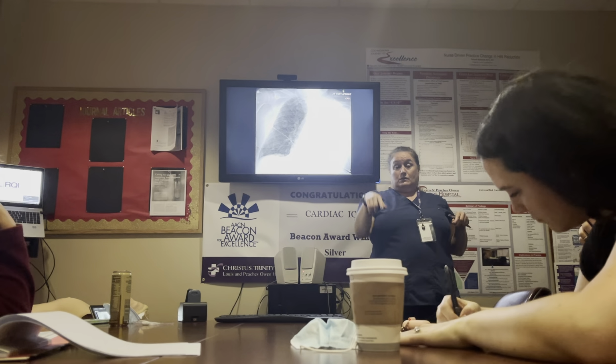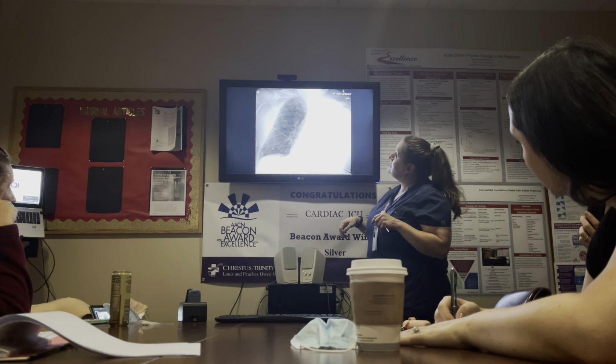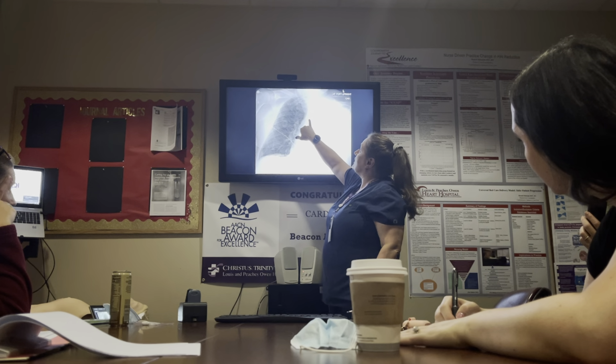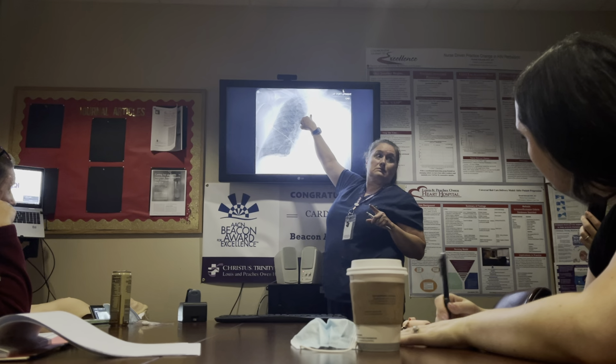It looks like the trach tube is like in the right lung, it's angled that way? Is it just because it's kinked that way? Yeah, it's just kinked. Because the tube is actually sitting here and the carina is sitting right about here. So it's not mainstemmed, and I'll show you a picture of mainstemmed in just a minute.